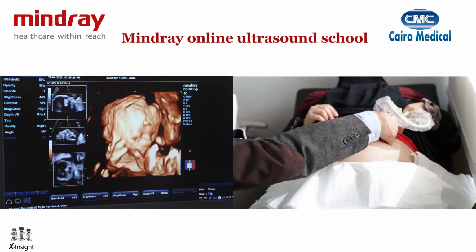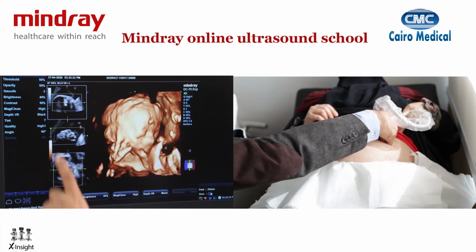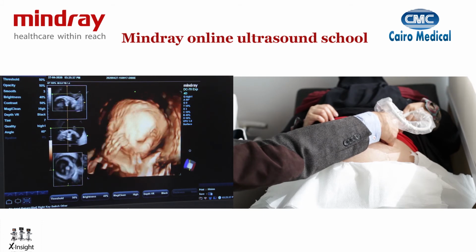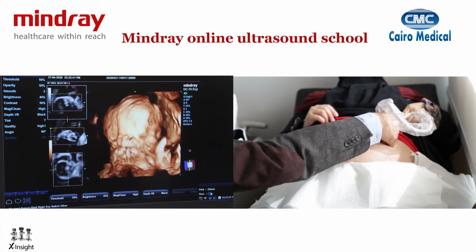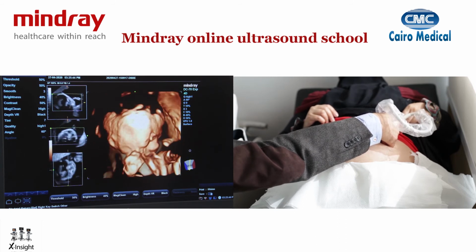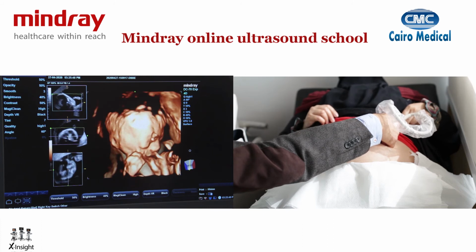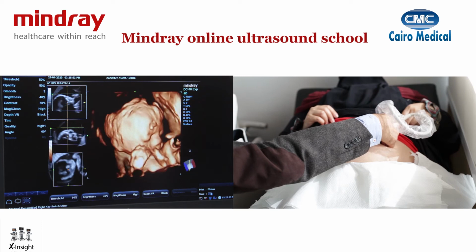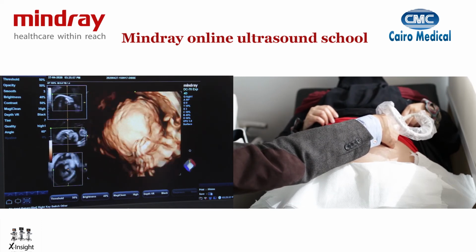And then what I can do is actually move using the 3 axes that I have. So I have the x-axis moving the baby this way. You can see from this reference image. I have the y-axis. I can flip the baby around. And I have the z-axis, so I can actually move the baby from down upwards. So I can actually get a view where I can see below the chin, or here I can see from the top of the nose. Or I can move the baby around in that direction, or facing downwards, so I can get the baby to face upwards, or face downwards.